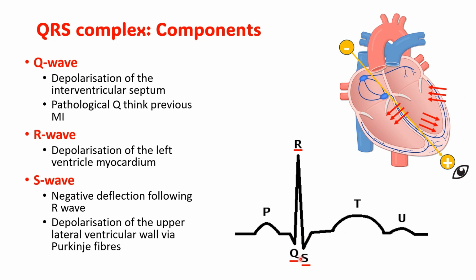deflection. And it's not on this diagram, but this point here at the end of the S wave is called the J point. J point is at the start of the ST segment.